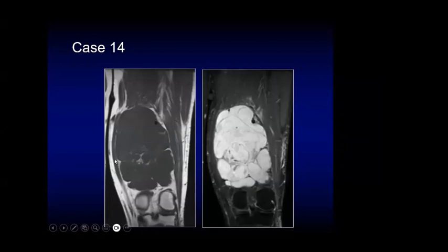So yes, this is the tumor, the muscle on T1, and in the center of the tumor there's abnormal signal intensity, non-homogeneous, high signal. Okay. It is high signal on T1. What do we call it? Either hemorrhage or fatty. Okay, so fat, yeah. Fat on T1, yeah.